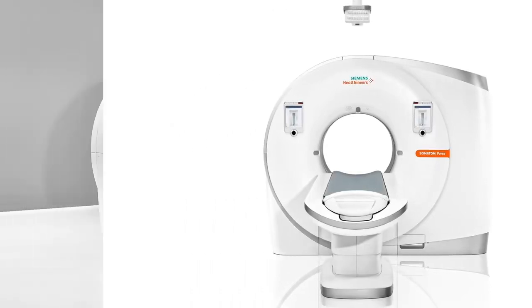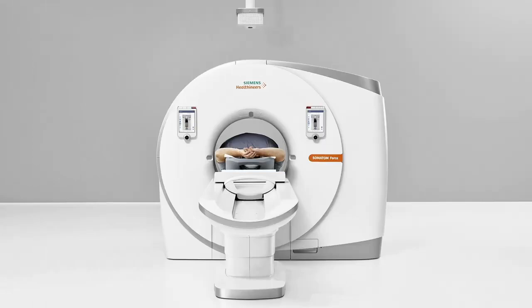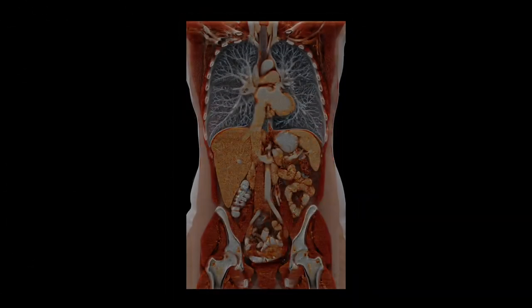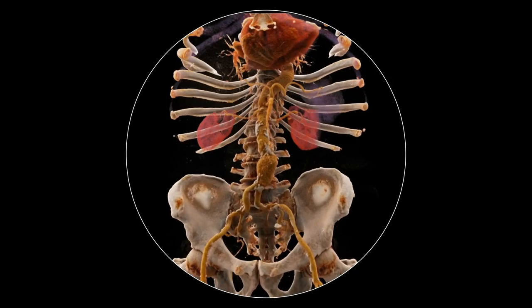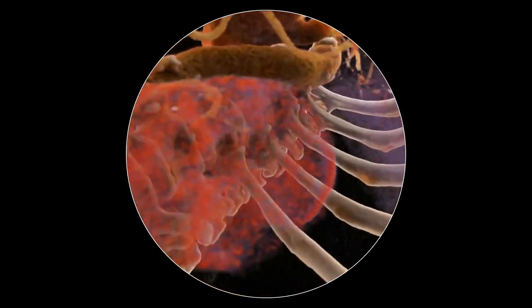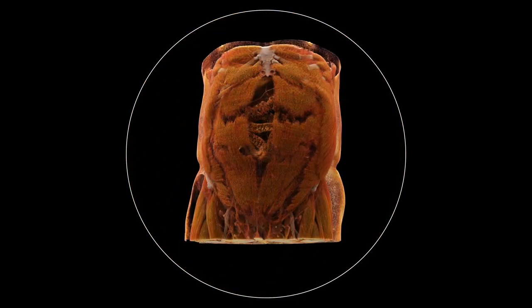Tomography, more commonly known as CT, is a diagnostic procedure that plays a vital role in medicine. It provides a crystal-clear view and answers many clinical questions, often within seconds. CT picks up even the slightest pathological changes and helps characterize soft tissue. How does it work? Let's take a closer look.